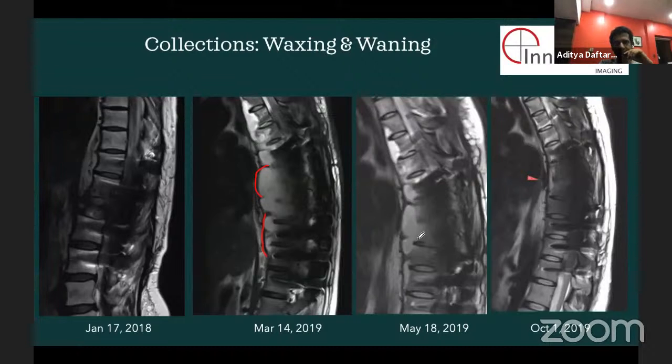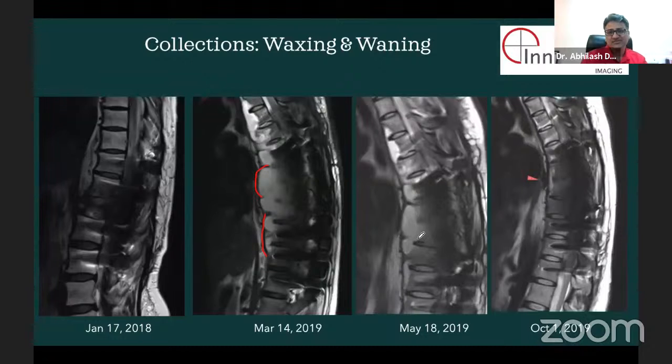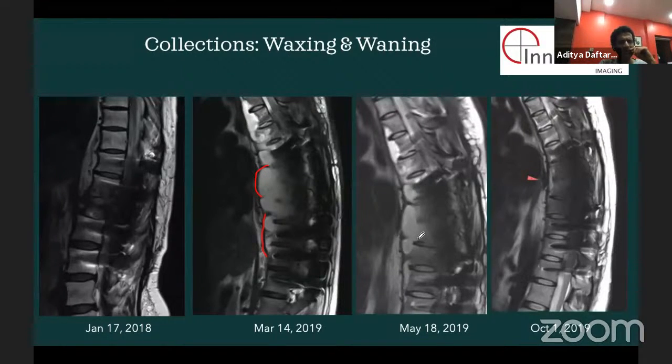Okay. So would you actually put in contrast just to discern between them? You might, but oftentimes you don't need it. Most places by default will give contrast because you want to see enhancement of something somewhere else. And oftentimes with the magnetic susceptibility artifact, it may be harder to see.